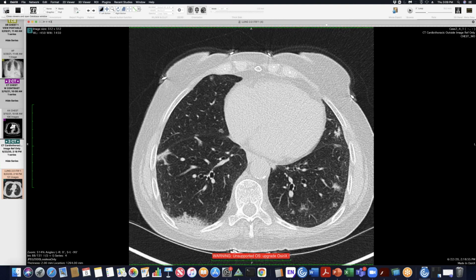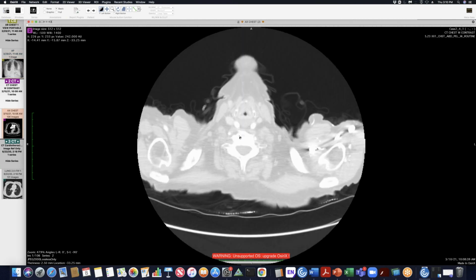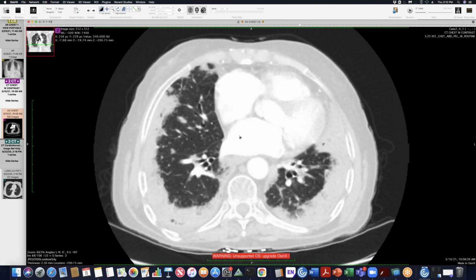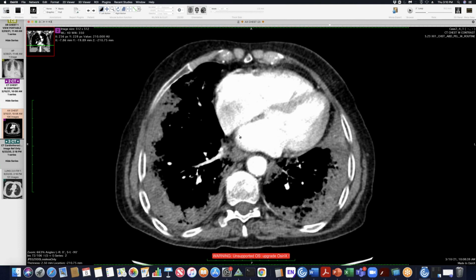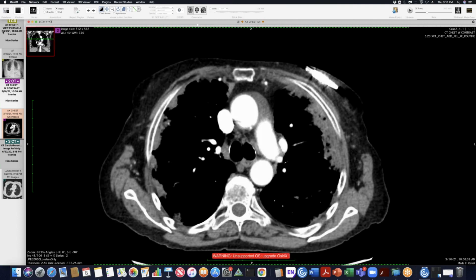That is impressive. It looks so symmetric. It almost looks like eosinophilic pneumonia or something. Yeah, I guess that would be a good differential for this peripheral pattern. Is it low attenuation on the soft tissue windows? I know you've got contrast on board, but yeah, pretty low there. That's a good thought for a differential for this. Yep.